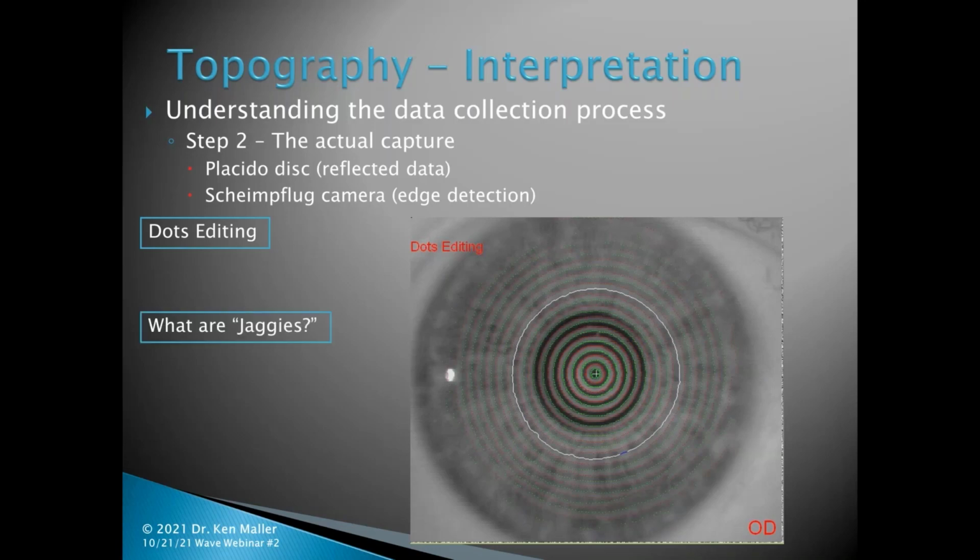And you will see here that I have cleaned up these maps from the jaggies. The jaggies are where you will see in just a couple of slides forward that the rings end up mismatching which ring data goes with which ring capture. And so I went ahead and fixed the jaggies on ring number 17 here by connecting that little blue connector bar there.